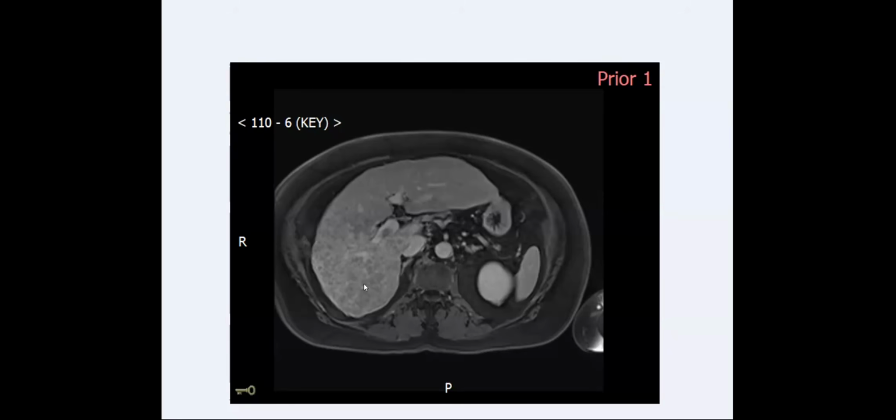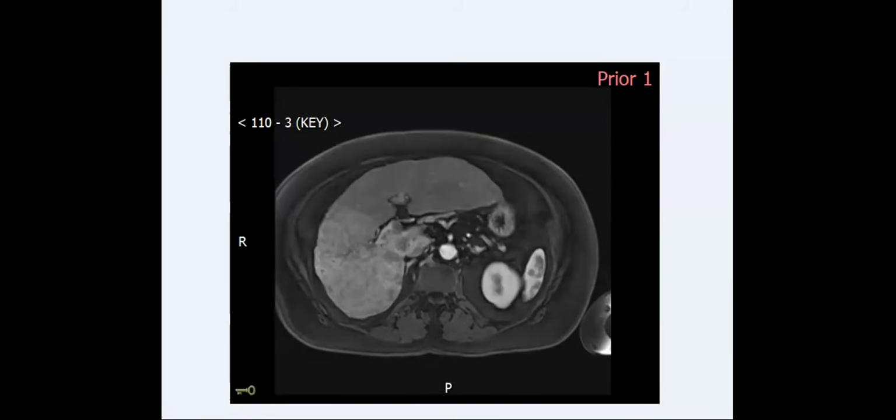Do you have the arterial phase? I do. Okay. So it is kind of enhancing and washing out. So we could say that this is HCC. Sometimes when it's infiltrative and there's so much portal vein tumor thrombus, it doesn't become arterial enhancing because the artery is trying to save that lobe. And so technically it doesn't meet criteria, although the TIV basically makes it HCC. But sometimes in those cases we say, okay, correlate with AFP, and then we'll feel more certain. Sure. Yeah.